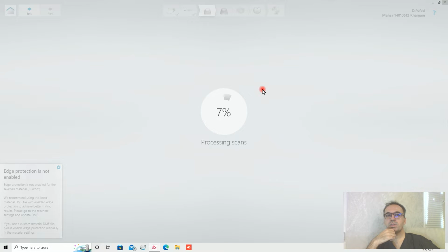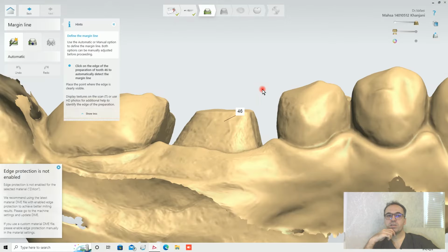You can see a little bit of improvement, especially in case your AI design is turned on and you can use AI design. You should have a good CPU and lots of RAM to do this. Many times systems with 16 gigabytes of RAM don't run well. I prefer at least 32 gigabytes of RAM and a recent i7 or i9 processor.